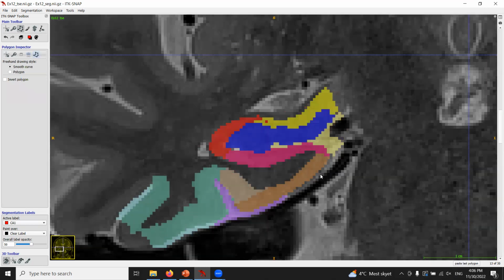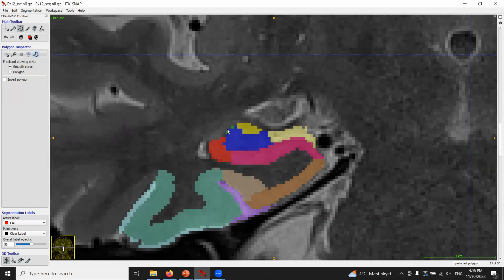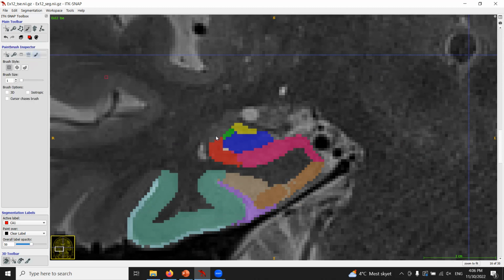So this slice would be a bit harder because there's red and yellow, so I'll skip over that. I'll skip over this one. But then this one maybe looks more complicated, but it's not so hard. So the border in this atlas is done perpendicular to the CA cortex.